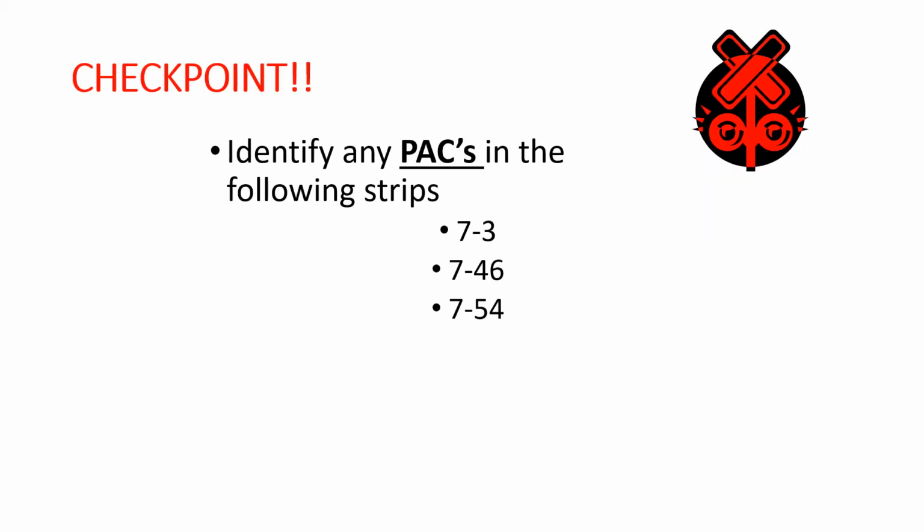Let's look at the following strips, 7.3, 7.46, and 7.54. Why don't you pause the video, go through those three strips, and then restart the video, and we'll go over them again, and let's see if you can identify and recognize PACs.